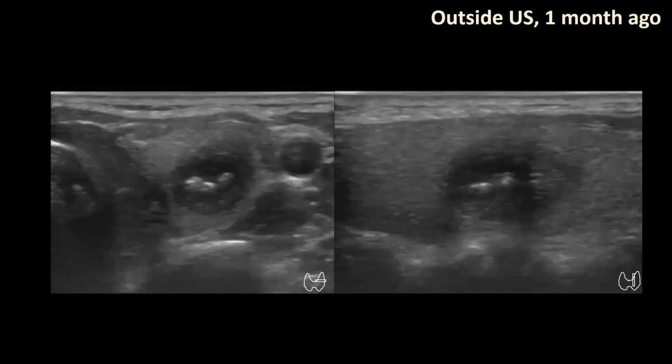The patient had a neck ultrasound at an outside clinic because she complained of neck discomfort. And then she proceeded with FNA after finding a thyroid nodule. A mixed echoic nodule is seen on US from the outside clinic before FNA. You can see an echogenic portion inside the lesion, and it is difficult to distinguish whether it is colloid or air. It seems almost impossible to diagnose a piriform sinus fistula only with this ultrasound image.